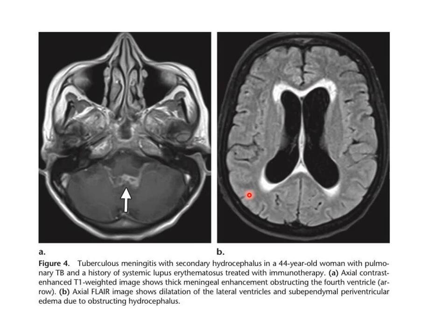This is also meningeal enhancement in the basal cistern with dilated lateral ventricles, and there is also hyper-enhancement because of the edema from the obstruction. This is not enhancement, this is increased transependymal flow. It indicates active obstructive hydrocephalus. Yes, this is T2, clear. Okay.